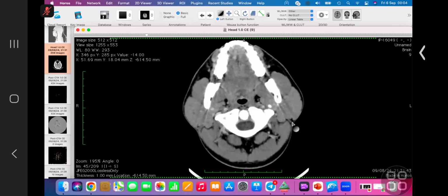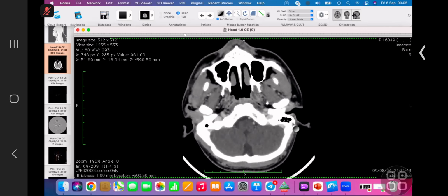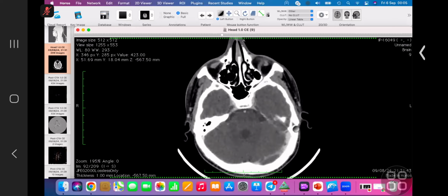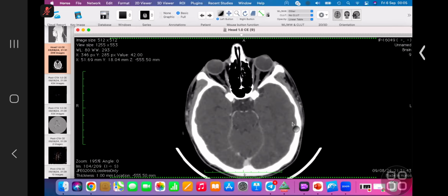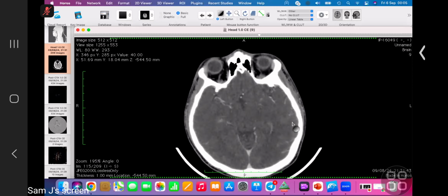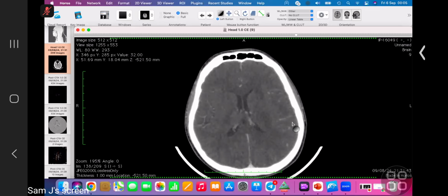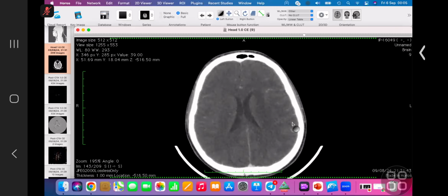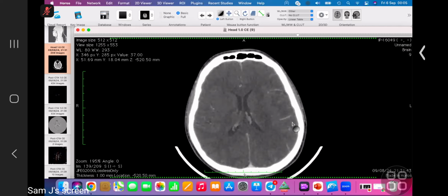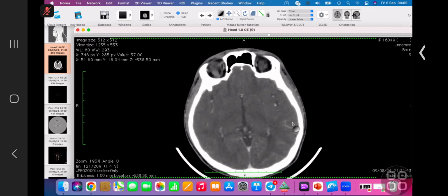Okay. Do you see any abnormality? And what do you see?